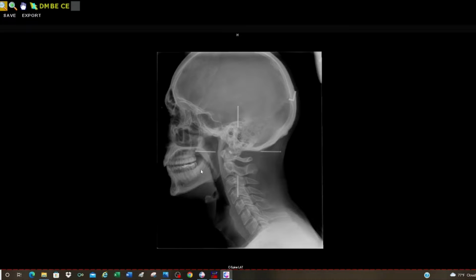This is your mouth. We got some fillings in on this patient. This is the atlas, this vertebrae right here. This is the atlas, the first bone of your neck where the skull is sitting and resting on top of. This is the bottom of the mastoid, which is a little part of your temporal bone on the side of your head that I need to mark. And this is the bottom of the patient's earlobe as well. So I got a little marker for both of these, and we'll talk about that in future videos. This is the second vertebrae, the axis. And then we start to go into the normal cervical vertebrae, the third, fourth, fifth, sixth, seventh cervical vertebrae.